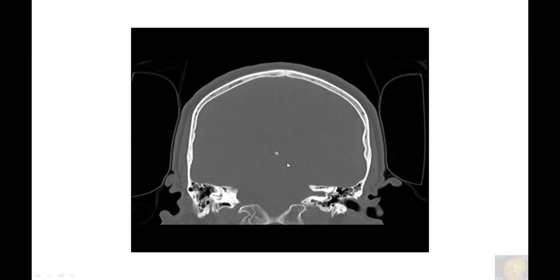This is a calcification within our pineal gland, and the calcification is associated with aging. The older we are, the more likely we have a calcified pineal gland. It regulates sleep-wake cycles, and seasonal changes in animals. It is associated with hibernation. So even though it doesn't see the light, it does regulate the timing of our body. Some animals can detect some light, especially if there is a hole between this gland and the outside of the body. So this is our third eye.